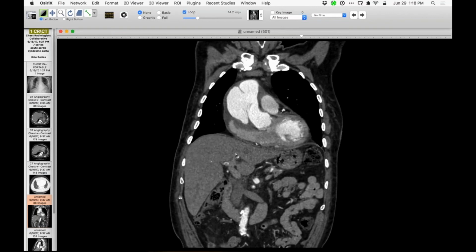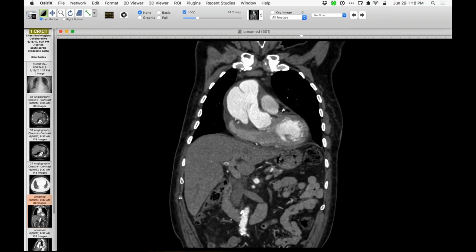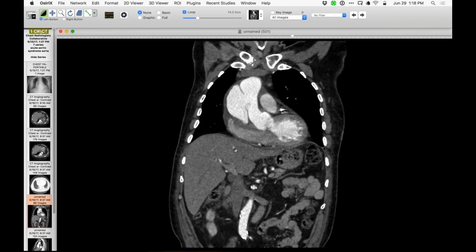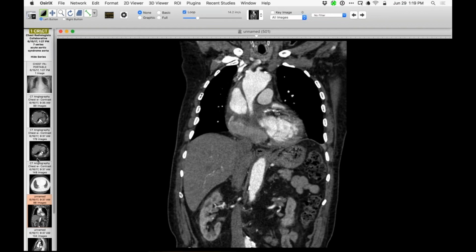So that's pretty large. What's interesting is several things. One, there's quite a lot of opacity here inferiorly. So this is the atrial appendage that appears a little compressed and displaced by something. So the non-contrast containing something down here near towards the aortic root and then the non-coronary sinus. And then let me just go to the axials here.